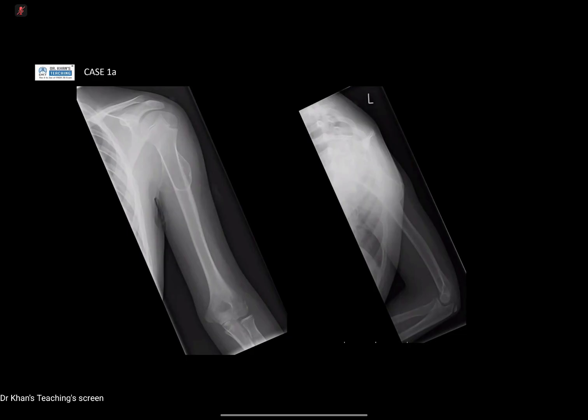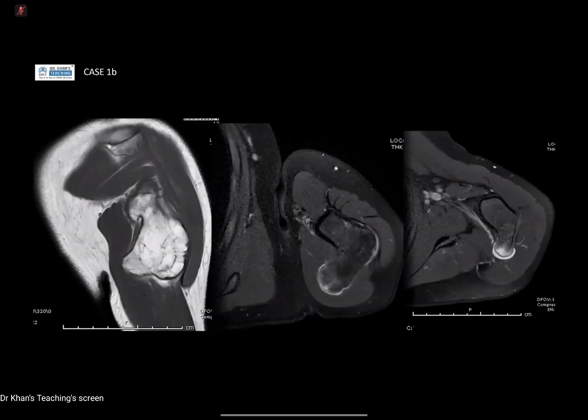Okay, great. So if I show you the MR here, and you correctly identified this as an osteochondroma, you can see that medullary continuity within the lesion. You talked a little bit about the cartilage cap, and yeah, you're right. So you're looking for anything over about 1.5 centimeters in adults. It varies in children. I think it's more of a clinical thing. You'd be guided a little bit clinically. Is there anything that you wanted to mention on the MR?